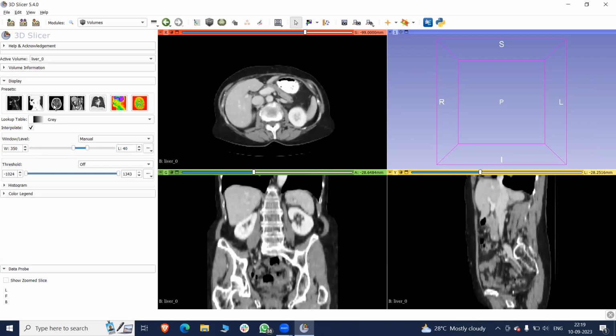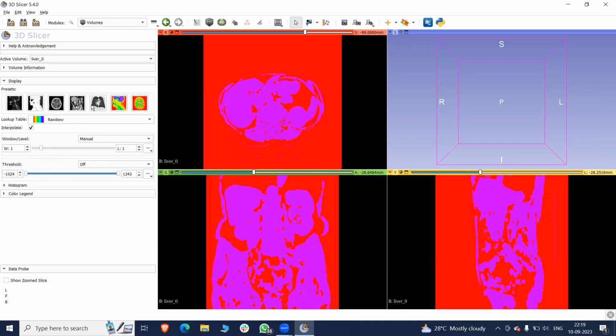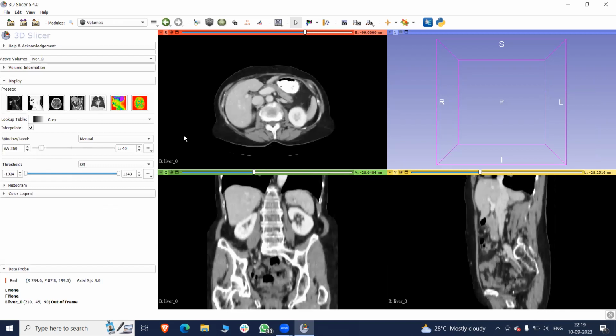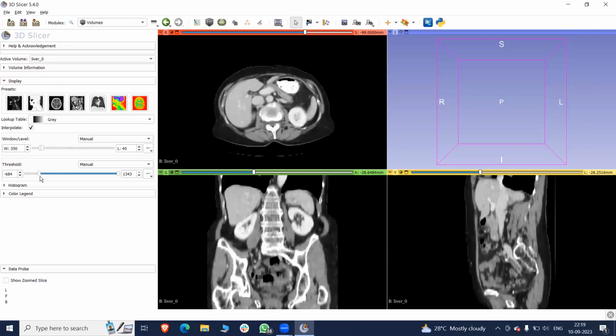These are some better alternatives to choose. Okay, so this one is better, I think. You can play with these values over here. This is just the threshold, and this one was the contrast. Let us keep it here for the time being.